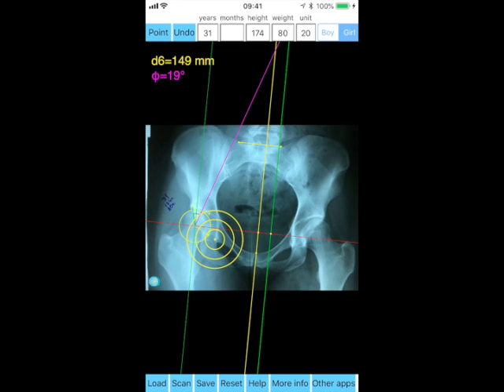In the same manner, you mark the V10 point, which is the lowest and most lateral point on the acetabular teardrop, and subsequently you mark the point where the lower contour of the head intersects the posterior-inferior acetabular margin, point D11. Finally, you mark the site of insertion of the hip abductors on the greater trochanter, point T12.